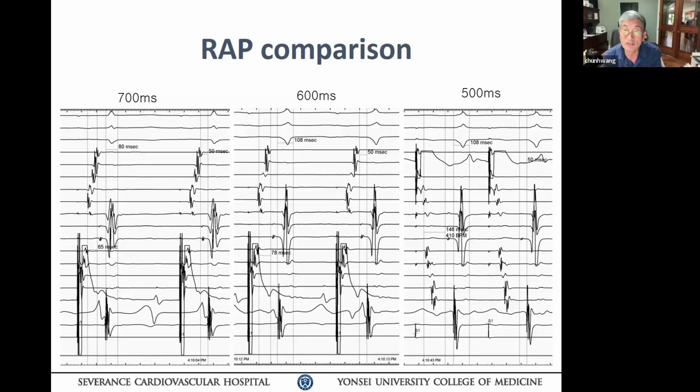Because then the next question is where is your pre-excitation ventricular pathway inserting? That would be the question. So then your HV should change regardless. It doesn't change. So it's very hard to argue here that this is a node ventricular accessory pathway.